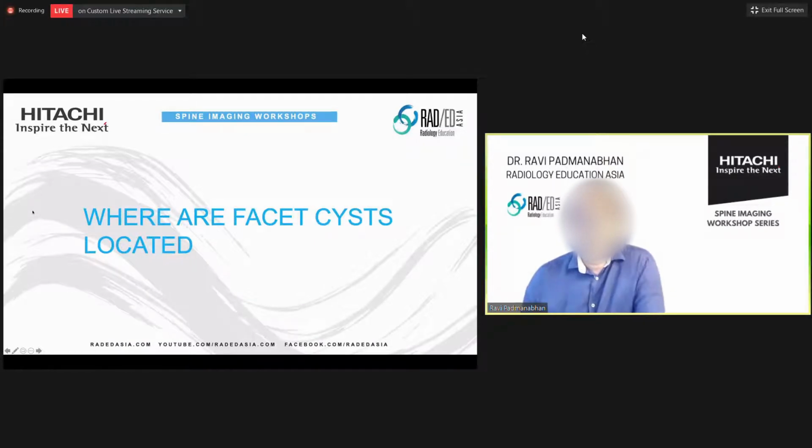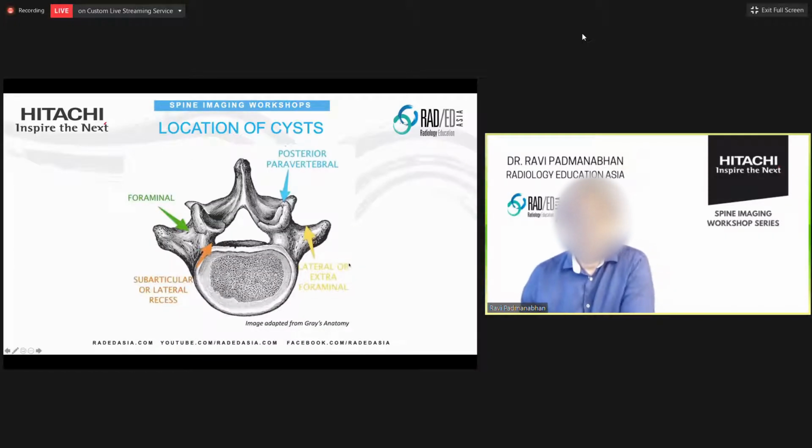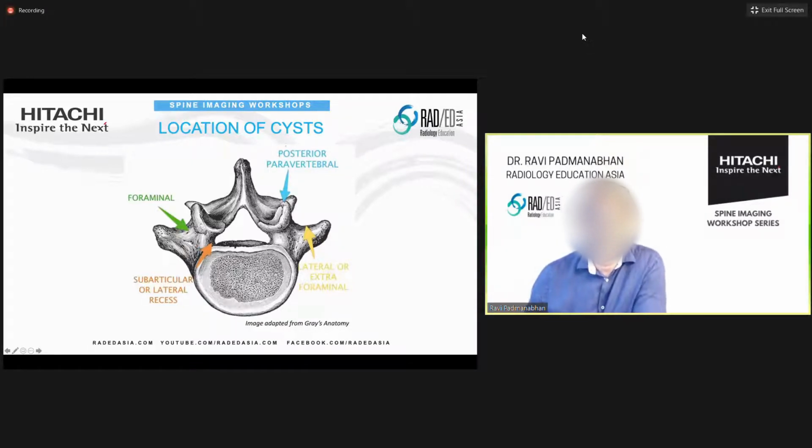Okay, so where do you get cysts? Cysts are basically due to degeneration of the joint, and you end up with synovial cysts. So there is some connection. Often there's a connection between the cyst and the joint. So if we look at this image here, we have a number of locations where the cyst from the facet joint can go. So it can go into the subarticular recess. We'll go into what that is in a moment.